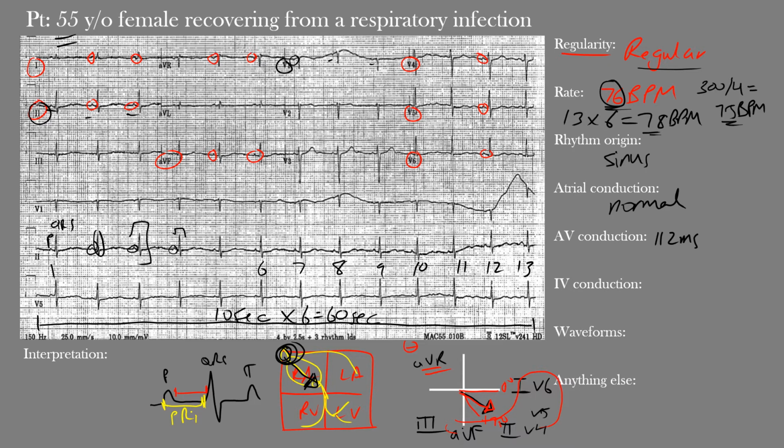And we're saying that this PR interval, okay, is somewhat short. So if you look here at our rhythm strip, here's a P wave, and then we have our QRS, so it'd be from there to there. It's a little hard to make out, but you can see that it is clearly below the 200 milliseconds, or one of those thick lines. Okay, so it's within normal range, but still it's on the shorter end. It was actually measured at 112, we said. So we would consider that kind of like the short normal. All right, and we'll see why that's the case.